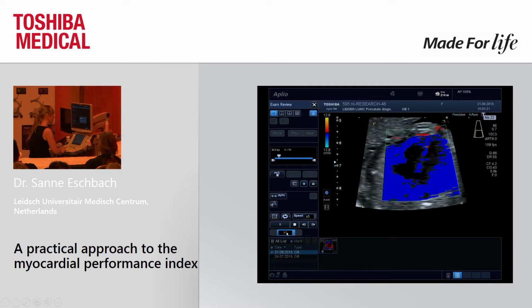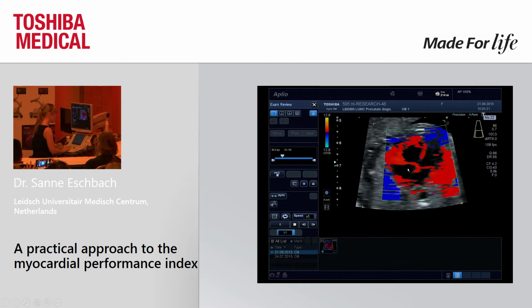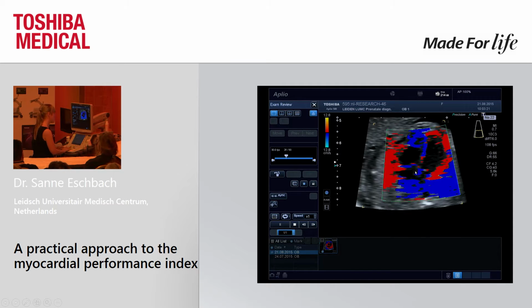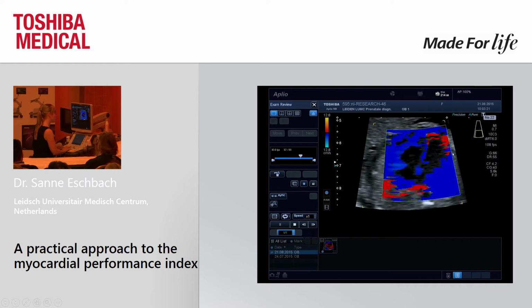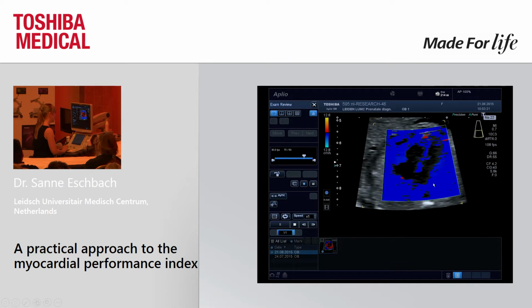Okay, so I wanted to start with just a clip which is already a data set that I made on one of my research patients. You can see it's the 4-chamber view. Here it's the spine and the ribs. And here is the abdominal side. So this is the right side of the heart. This is the left side of the heart. This is the septum, and you see clearly the AV valves. I cannot show you the knobology, but maybe later on people can watch closer.